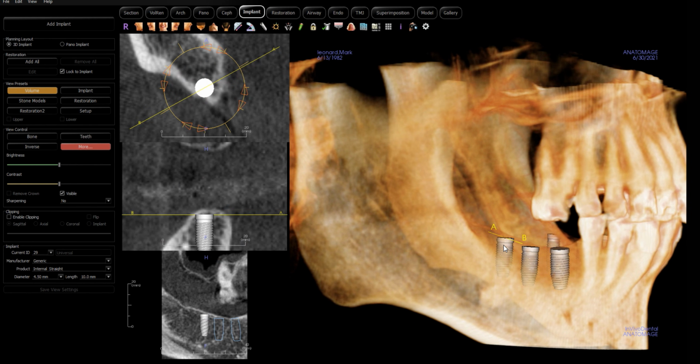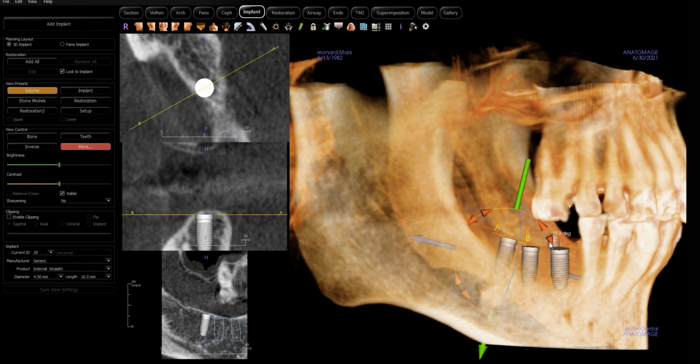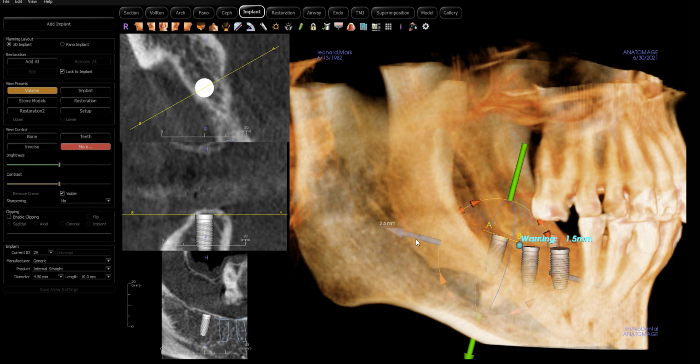Now, is it necessary, if we splint these implants, to keep that implant parallel with these? And the answer is no. I will often place this implant, something like this, so that you can get the drill in there. A lot of times this patient has upper teeth that prevent you from getting this second molar implant more upright.